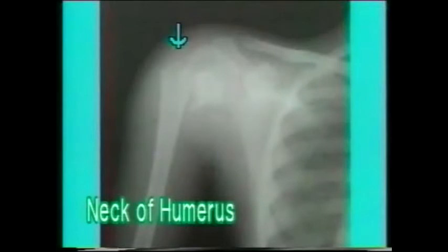This is a typical anterior dislocation of the right shoulder. This is a fracture of the neck of the right humerus. This is a fracture of the shaft of the humerus.